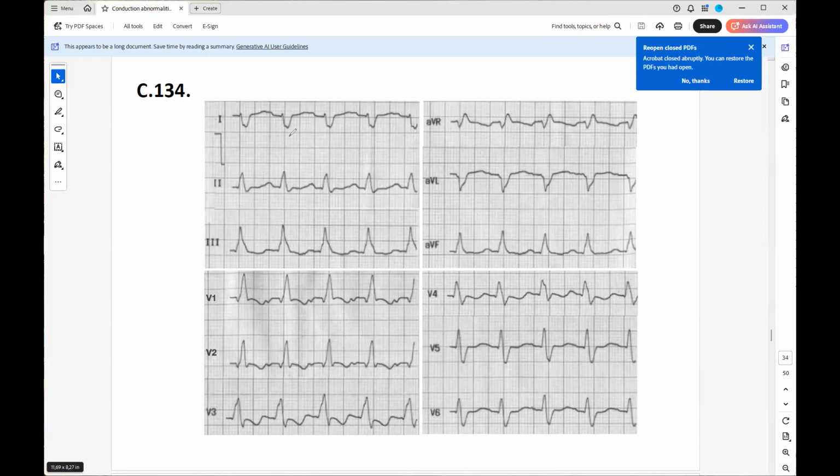70. What do you mean 70? 70 degrees. One is negative, okay? One is negative. Yes. It cannot be positive. It cannot be on the left side, I mean. AVF is positive, it's okay. But what does it mean? It means that you are on the right side, yes? And AVR is negative because the QRS complex is negative. So it means that you are between 90 and 120. Yes? Oh, so it's 110 or 100. Yes, it's okay. 110, 100 doesn't matter.